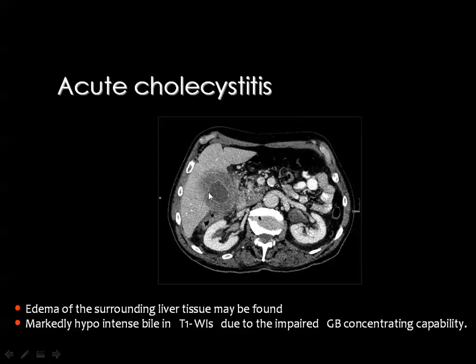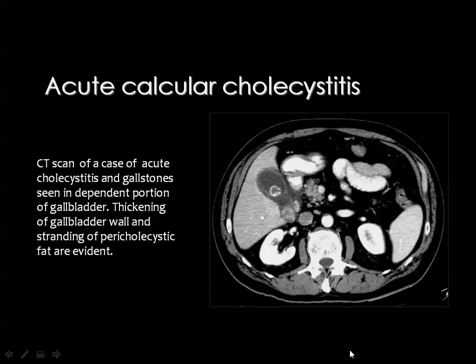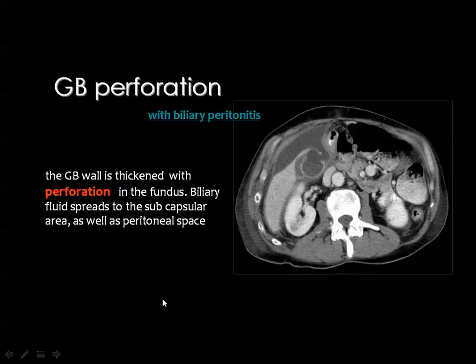This is the gallbladder with relative thickening of the wall and enhancement, and you see some fluid around the gallbladder itself, diagnostic of pericholecystic edema. And gallbladder inflammation may be associated with calculi and may not, and this is calculous cholecystitis. The gallbladder wall is relatively thickened and there is a stone inside the gallbladder.